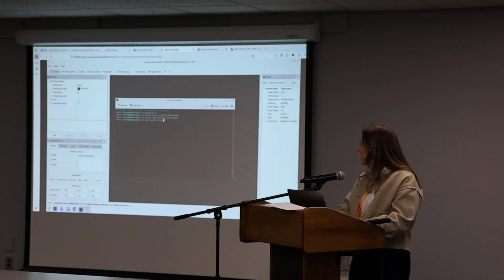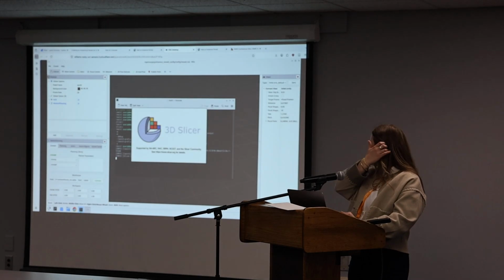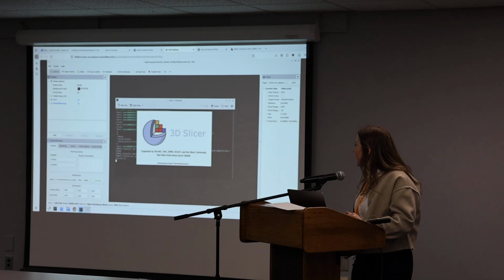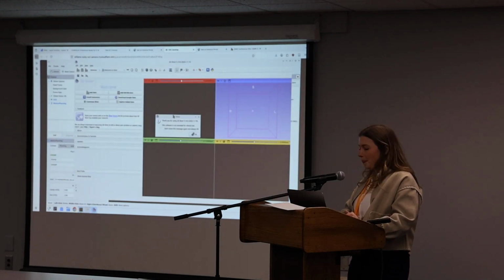You should just be able to tab for everything, so it's Slicer, ROS2 module, and then Slicer.launch.py, and that will pull up Slicer for you. Is that working? And yeah, these commands are on the website in the motion planning tutorial, so if you're well behind, just pull that up.